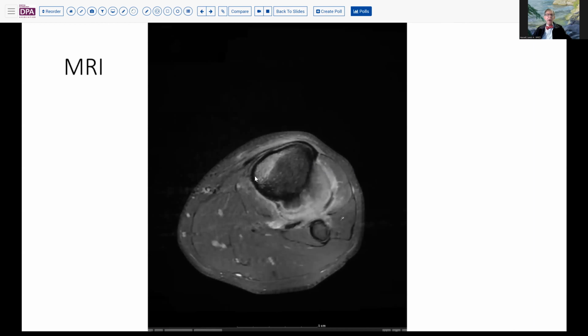Well, here's the MRI, which confirms some of that impression of a tumor that extends beyond the bone. And here you can see it sort of beginning to engulf the fibula. You can see the abnormal appearance within the marrow space, the sort of obliteration or alteration in the cortex, as you see here, around this portion of the bone.